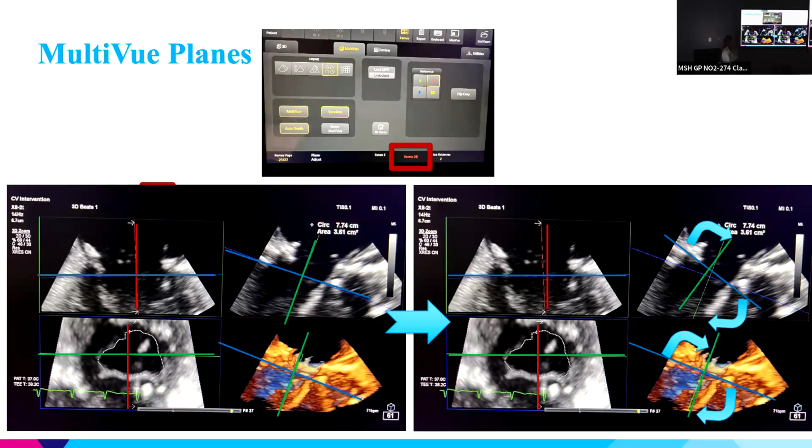Rotate GB is an option because I have the red reference plane selected. So I am working in the red box. This is the red box. Since this is the red box, the options in here are to rotate the G and the B. So these lines can turn, and that's what you see here, or what I'm trying to show. So that's how you rotate those planes.